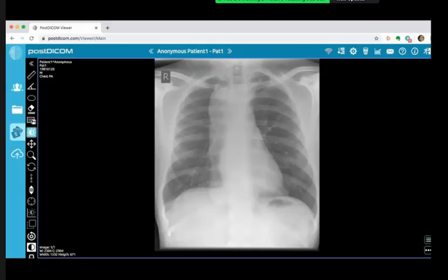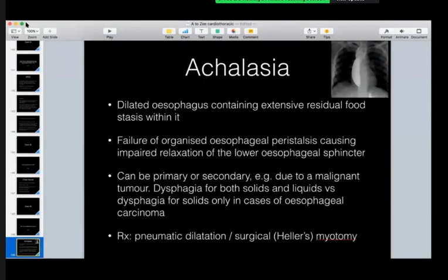So I think we are dealing with a case of achalasia. Next step would be performing an upper GI fluoroscopic study or a CT scan. They would still need an upper GI direct visualization, of course, to exclude masses. Okay, great. So this was a case of achalasia.